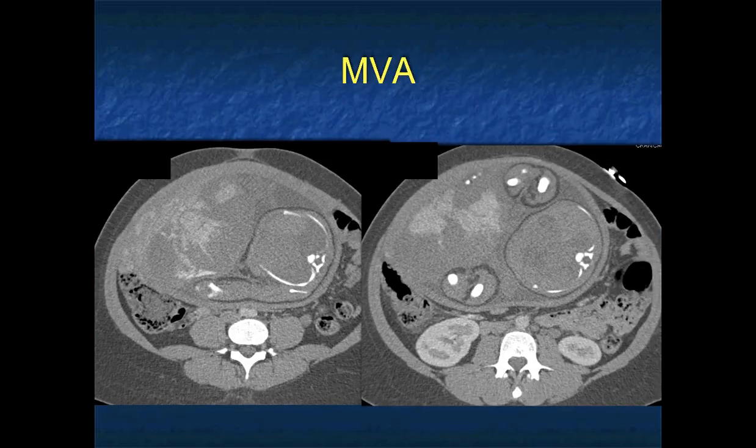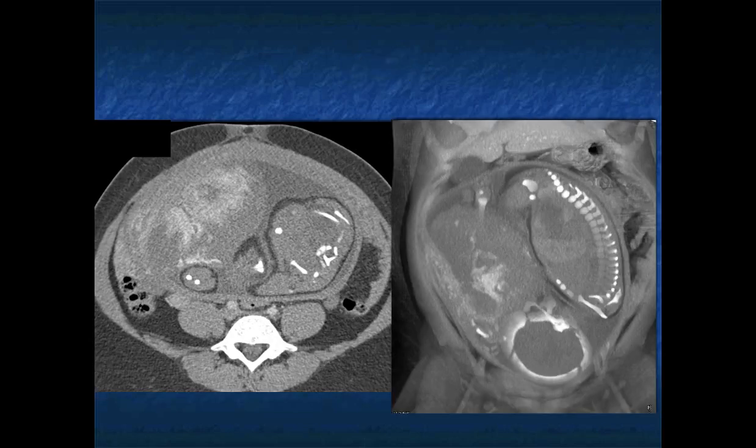Okay, this patient also is pregnant, post-MVA. Remember, we watch radiation dose on all patients, especially pregnant patients, but if a patient has trauma, we do the scan. What you can see in this case is a fairly large fetus. But then when you look, you see that the patient's placenta is poorly enhancing. It should be very bright and homogeneous. When you see a placenta that looks like this, it means the patient has had trauma, and the patient will then be delivered because you're worried about the survival.